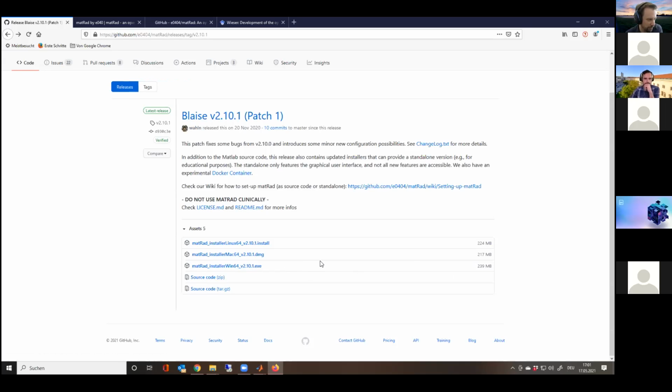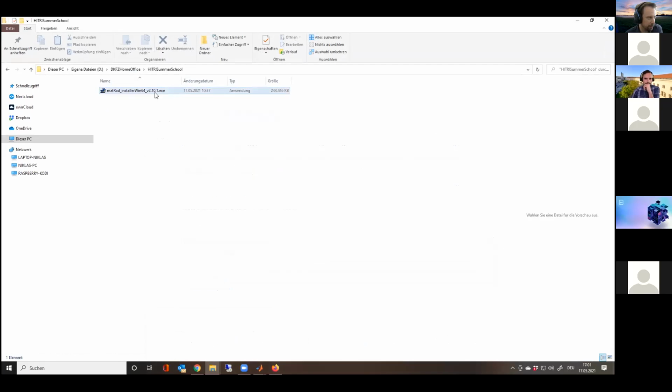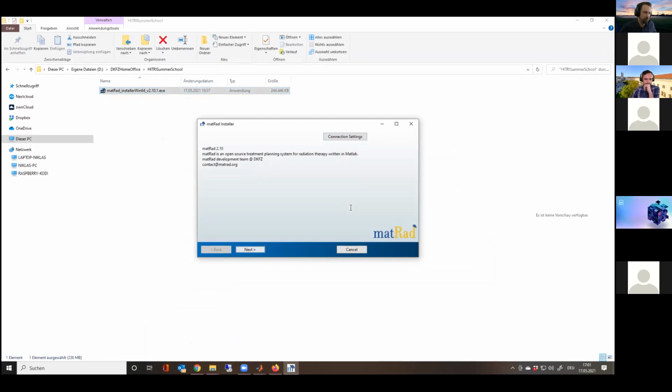I have the installer already downloaded. It's here, and I will launch it. For Windows, it requires administrator privileges, which I just granted. Then the installation screen will show up, and you get some information.